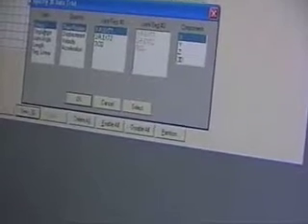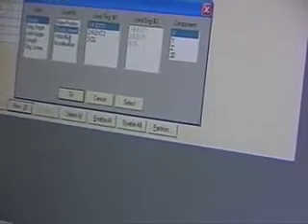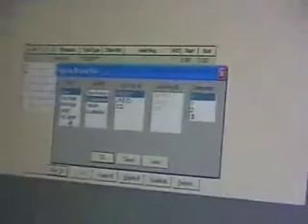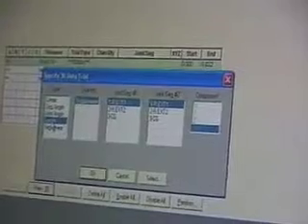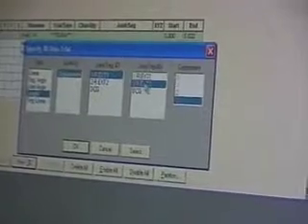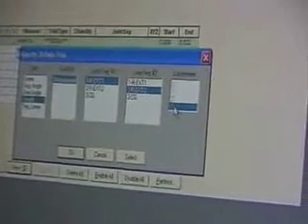So I go to 3D and I put the file in. And now I go new 3D information. And here's where we say what we want to see. So, for example, I don't have any joints, so I have to do linear displacement, meaning where the balls are in space, and I'll do segment. I'll do length. That would tell us how far separated they are. So I'll do length, displacement of point number 1 and point number 2, and we'll do it 3D. That's fine. Select.